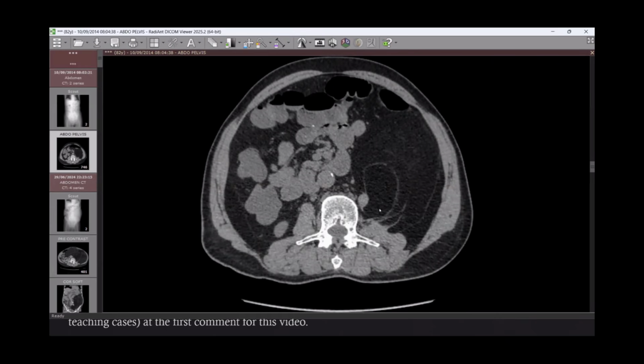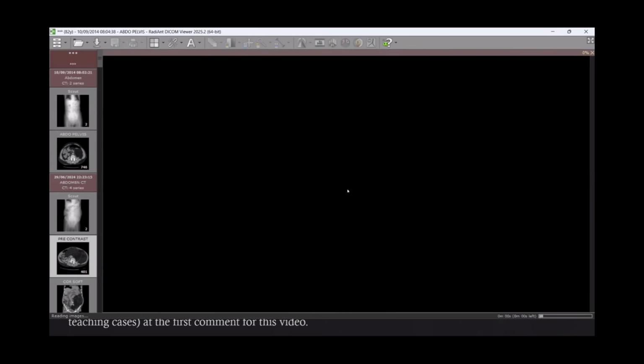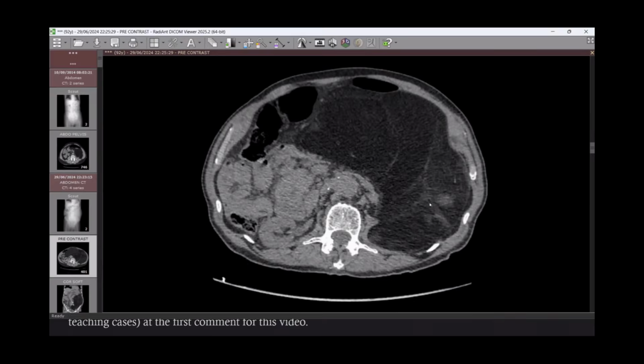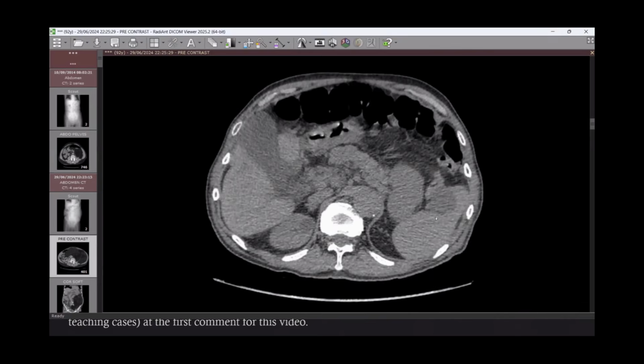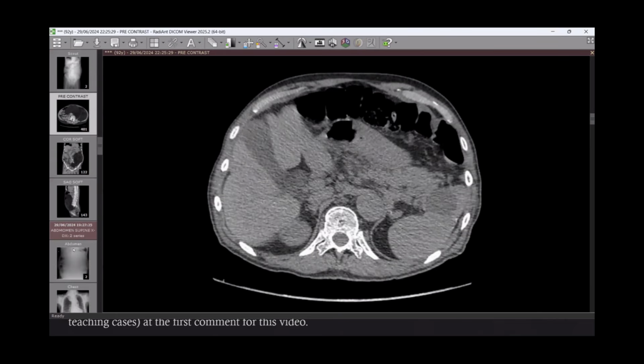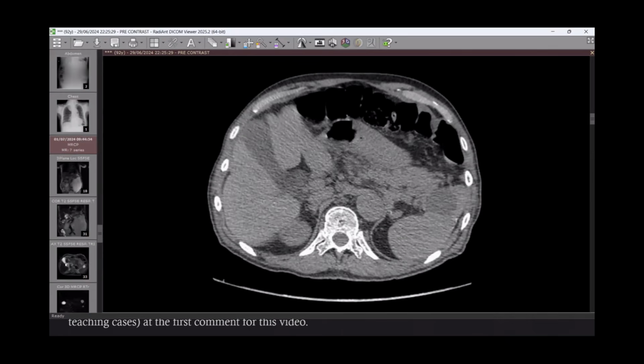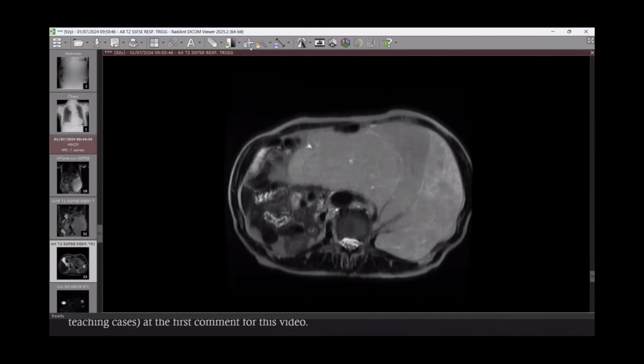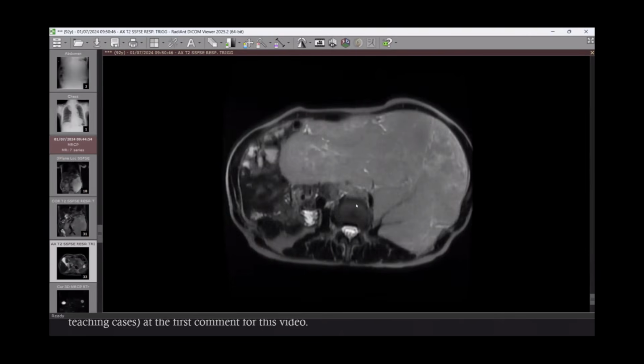Really, this well-differentiated liposarcoma may turn to other higher grades of liposarcoma with rapidly progressive behavior. But I can appreciate a low dense lesion in the spleen, a newly developed splenic cyst. This is a splenic cyst, really. It's not metastatic. And the clinician requested to do MRCP. I don't know really at the time what the indication was.